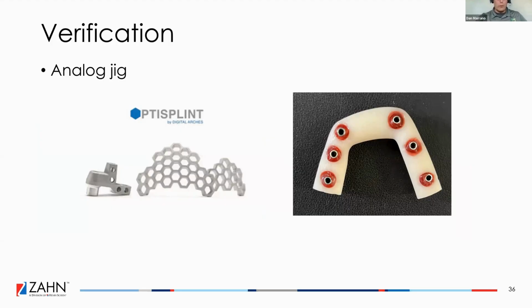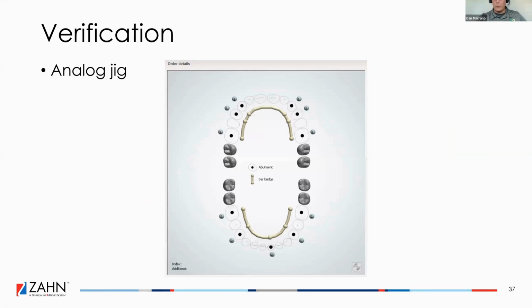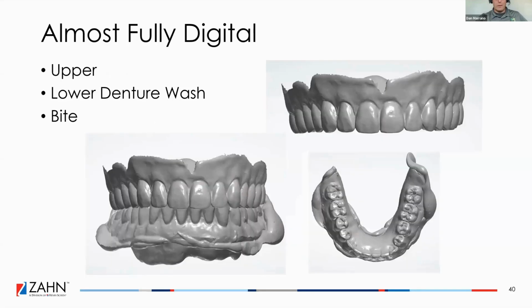But if you're going to, well, here, I want to show real quick how we made that jig there, because we stopped cutting in between each implant and we started luting in the center of them. We just make a simple bar in 3Shape, and we just punch a bunch of holes through it. We don't even go through the entire bar process. We put the holes in it, and then we print that out and save it. And we use that in our almost fully digital workflow.